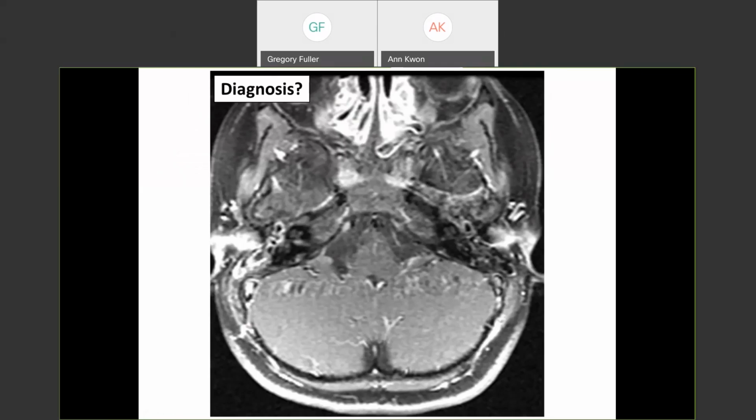All right, let's go back to this one. There are 2 intracanalicular vestibular schwannomas. The one on the right, which is over here, is a lot easier to see. If you are being methodical about analyzing this, you might start up here and look at the orbits, and you look at the nasal sinuses, you move here, here's the middle temporal fossa, you're looking at the sphenoid bone, could it be a hyperostotic meningioma of the sphenoid, very common. We're looking at the sellar region, we're moving back, here's the medulla, and you're always going to look at the temporal bone.